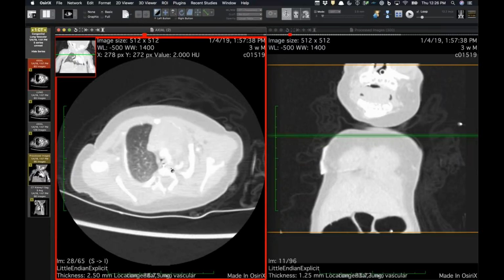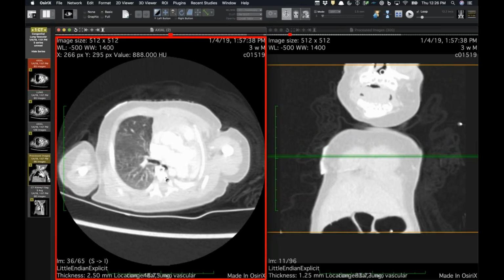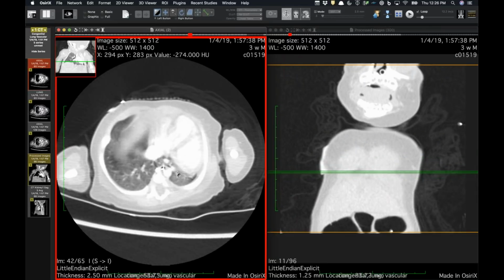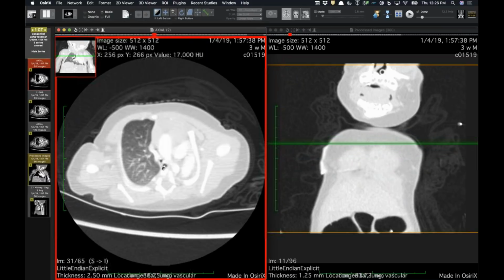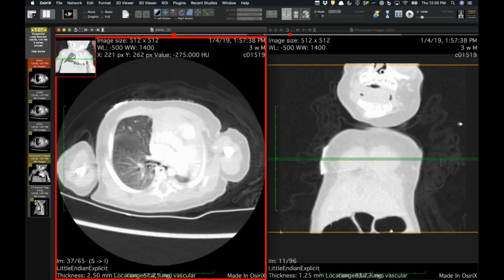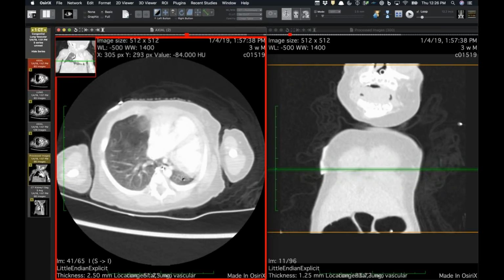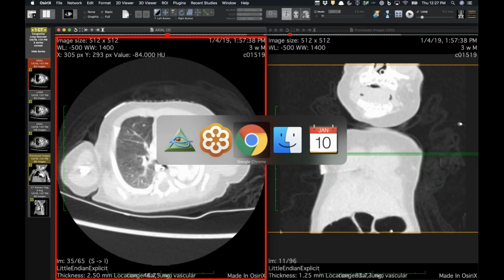But what I think is interesting is that this is not necessarily a case of left lung hypoplasia. Rather, it's a case of left lung agenesis. This was described as just a hypoplastic left-sided bronchus, but when you look at this, it just looks like a trachea that goes into a right bronchus with some sort of normal right upper lobe branching, and then a right middle lobe here, and then the right lower lobe, which then herniates across into the left hemithorax. Yes. And so this gets into the question of nomenclature.